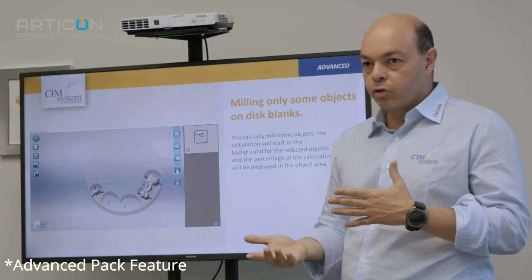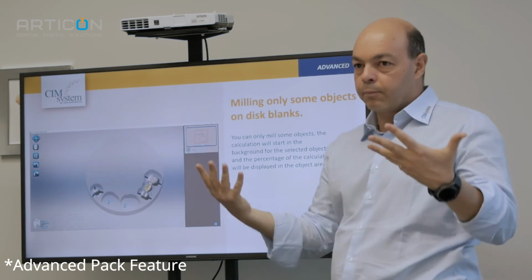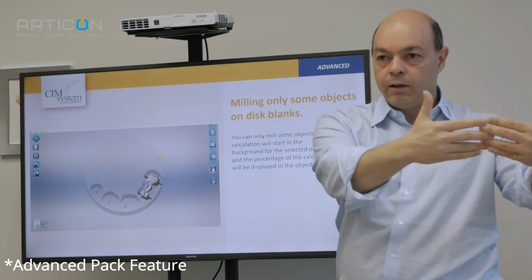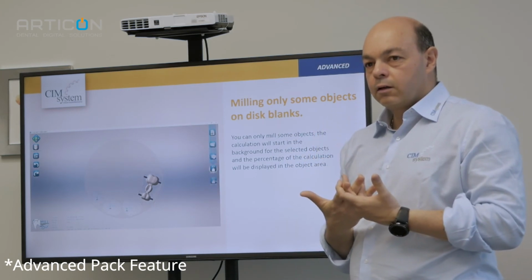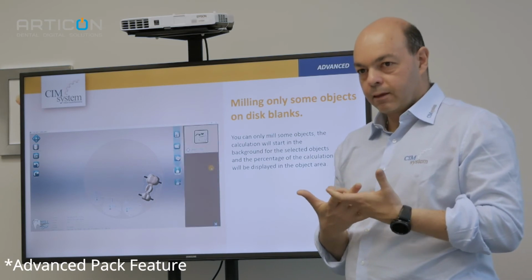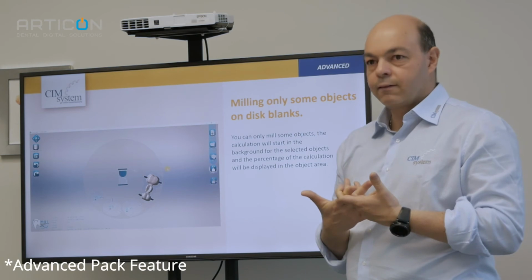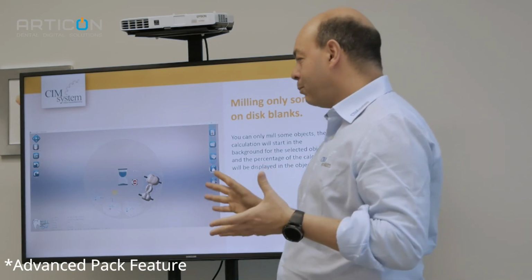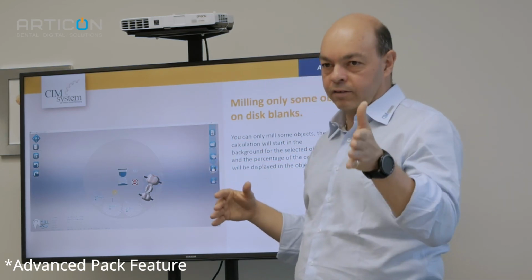Okay. In the future, I think I take 3. In this case, I have 3 STL files. I put in one. If you need, I put only one, and there is milling. So say if we load the full part, because it takes longer when the toolpath is for a full part. So if you only want to do 4 units, it can be quick and you throw it in the mill, and then do the rest. Yes. And then throw that in the mill. Yes. So. Okay. Only the small problem is in this moment I have 3 or more CNC files, but in the future I think I merge this CNC.